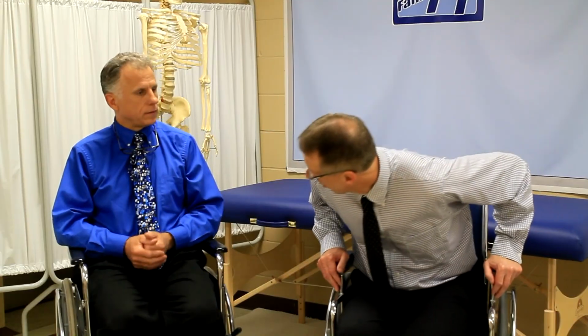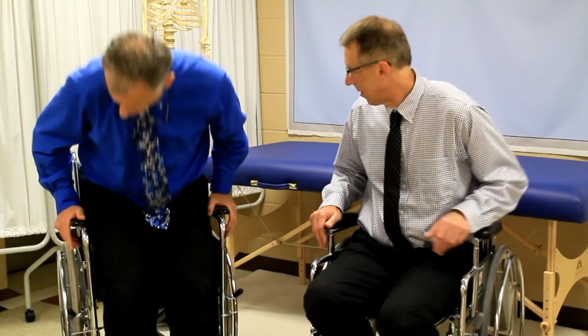Today we're going to talk about how to choose a wheelchair, the different things you want to keep in mind. Okay, let's start off with the first thing you want to look at. You want to look at the width of the chair. You want to make sure you can fit in the chair, right? Right, exactly. So how are you fitting in this one? I am fitting actually pretty good, Bob.